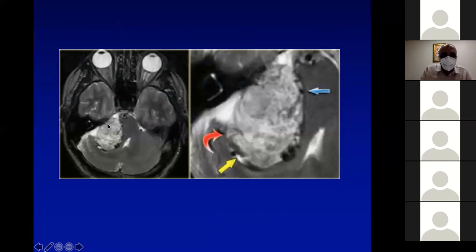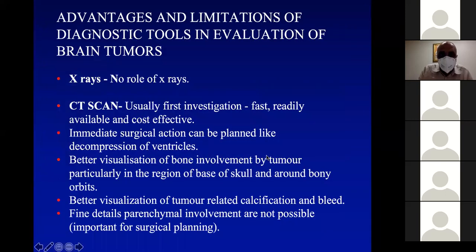Again, this is on MRI. When you magnify it, you can identify a small vessel. You can identify that this has an encasing or a capsule around it. So MR gives better detail, more detail than CT would provide. But CT would be faster and MRI would be a time-consuming examination.